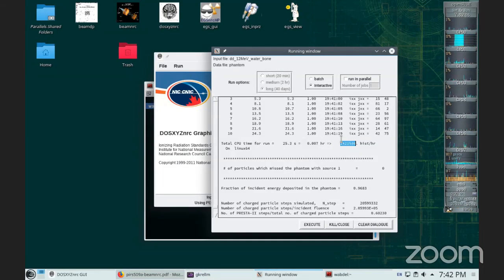If I launch something today and I want it to be ready by tomorrow morning, okay, I'll have 12 hours. I know, for example, 1 million today, I know that by tomorrow morning, this is not going to be done. What you do is you start, like in my case, I would do 100 million. By tomorrow morning, I would come and check and look at the statistics, the standard deviations. Do they look okay, or do I need to improve on that? Okay, depends on the application that you want. So this is done.